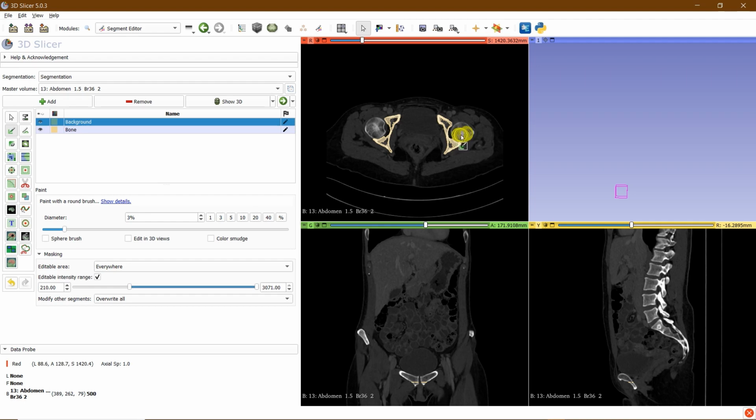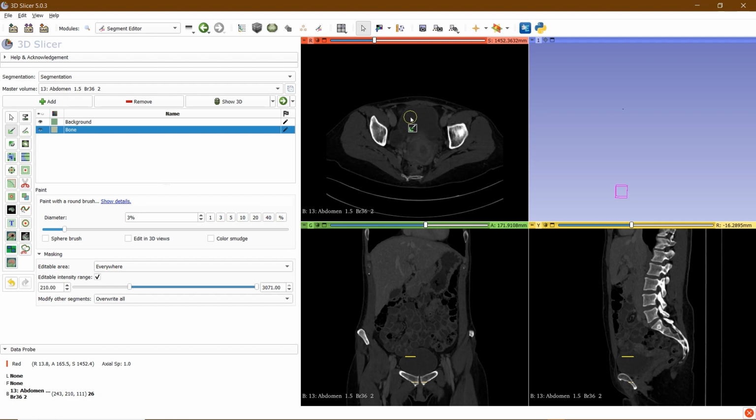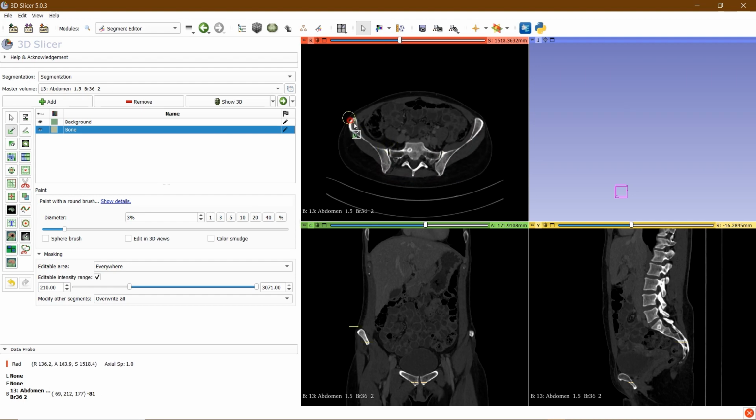Like at this place where I want to make a distinction between the acetabulum and the femoral head. Especially at this part of the pelvis, I can recommend to work very precisely, at least at one slice within every reconstruction plane, because this will make the semi-automatic segmentation much better. In general, I recommend to mark around 5 slices within every reconstruction plane, distributed evenly over the whole ROI.